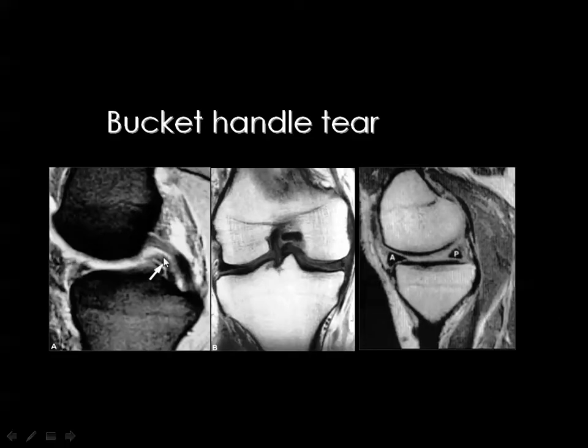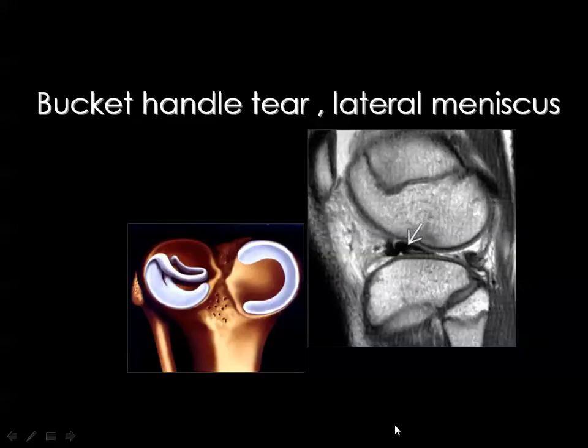Then you go to the level of the posterior cruciate ligament, and you see the double PCL sign, and this is the posterior cruciate, and this is the meniscal fragment. And if you go to the coronal image, you see a fragment present in the periphery, and the second fragment is present in the intercondylar notch below the posterior cruciate ligament.